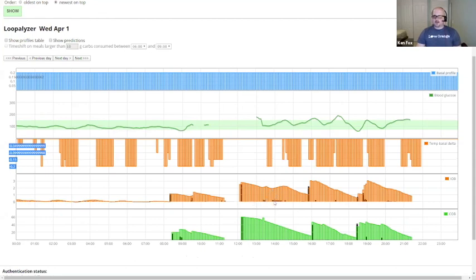The black dots are the boluses, and the bars up here is how much insulin on board there is. So this can be a really good report if you want to pick a couple of days to show your endo, if they want to kind of see what Loop's doing other than the day-to-day report. You could use this one too.